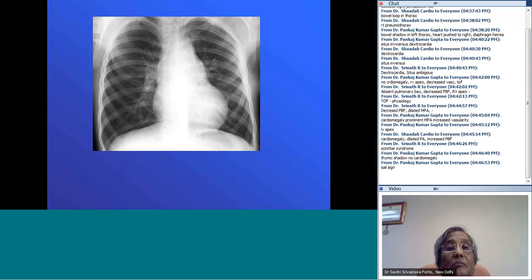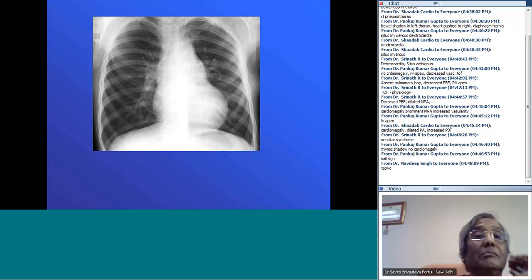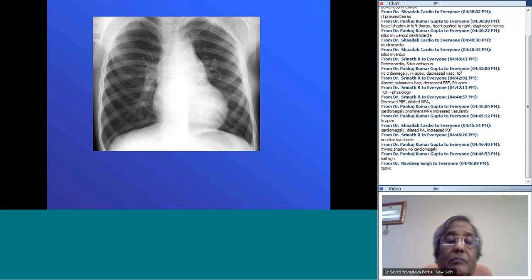Please try to give the finding and diagnosis. Only one person is attempting, then two people, one by one they attempt.